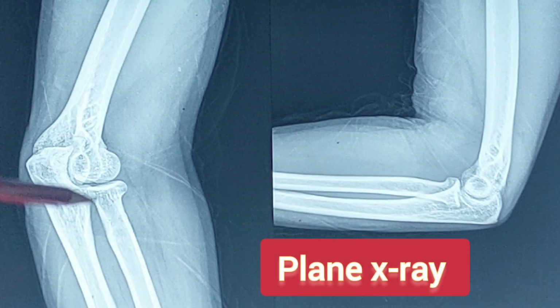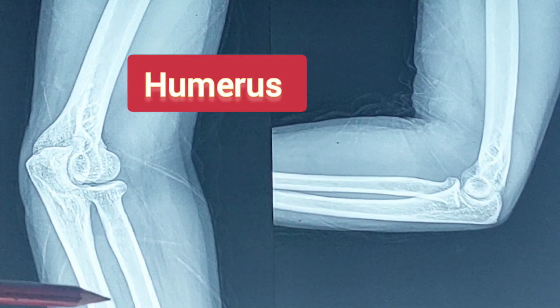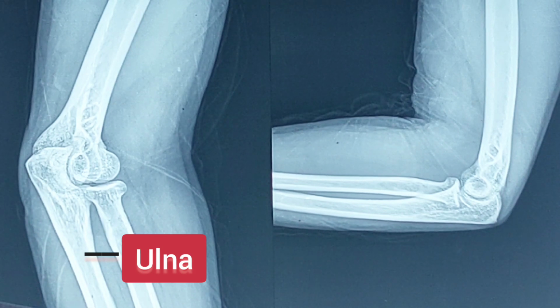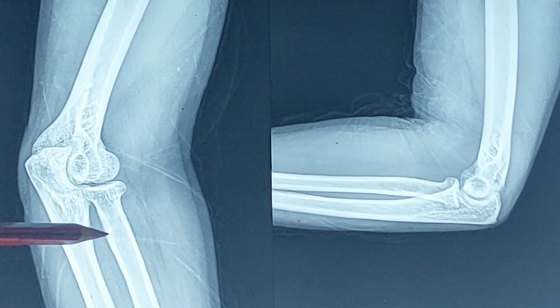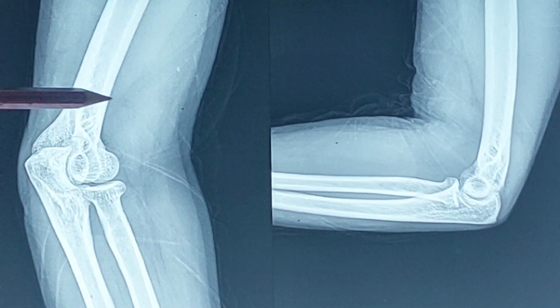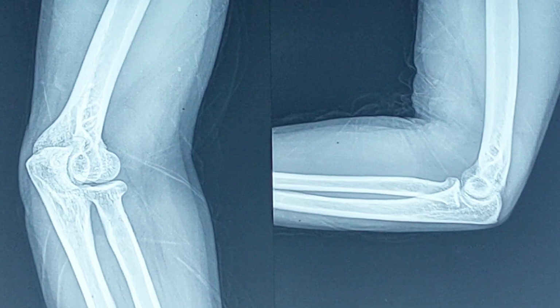Elbow region means the lower end of the humerus and the upper end of the ulna and the upper end of the radius, they form a joint here. So around this joint, including the bones and the joint itself, this is called the elbow region.